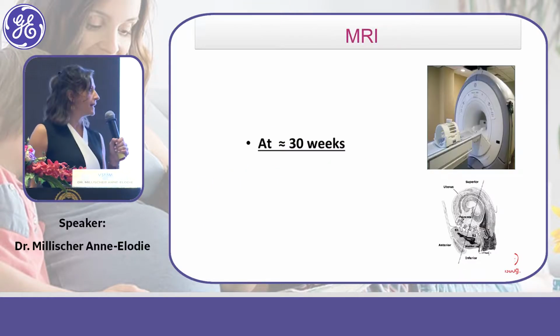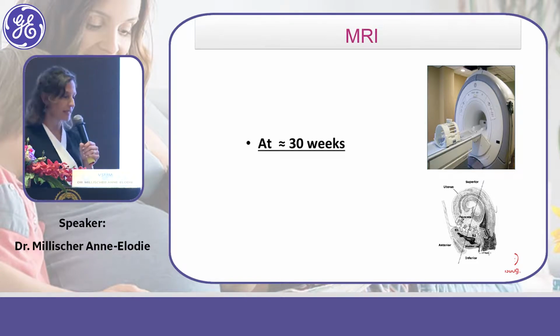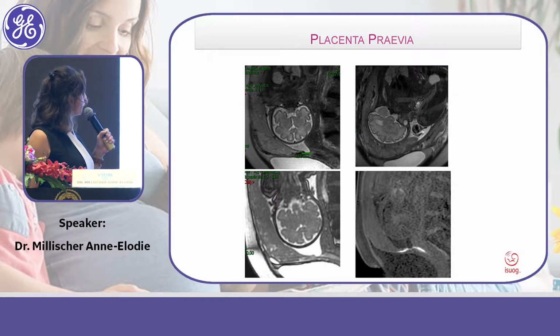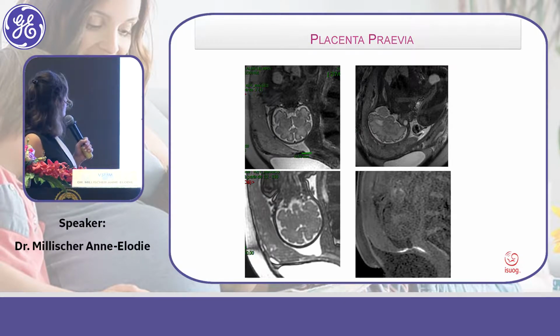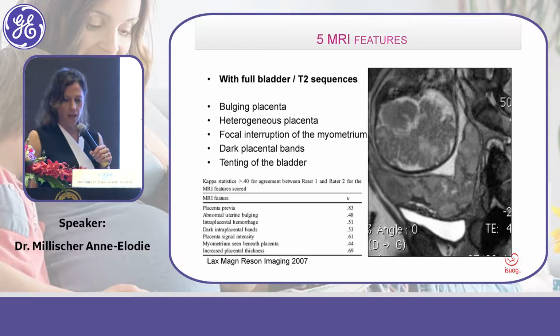We'll go through rapidly with MRI just to know the aspect that it can show. The placenta previa is correctly diagnosed with a very reliable measurement of the location of the placenta and the internal orifice. Và bây giờ mình sẽ khảo sát bánh nhau trên cái hình ảnh MRI. Thì cái hình ảnh hồi nãy cô cho thấy là cái bờ bánh nhau nó cách cái lỗ trong khá là gần.